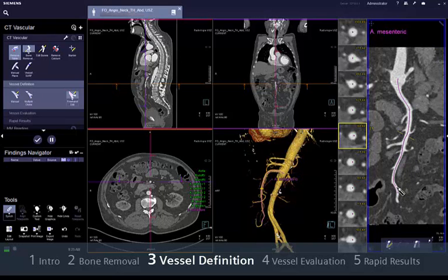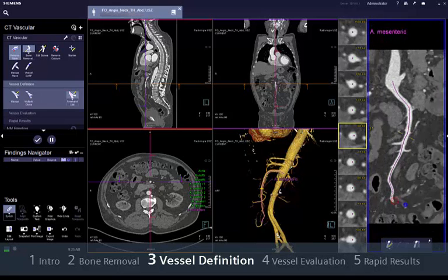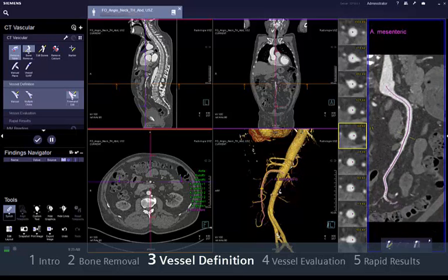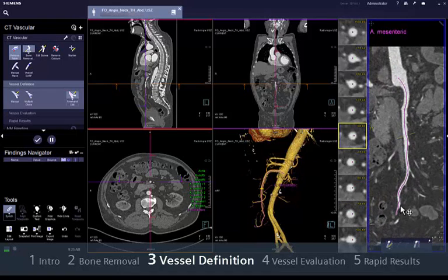You can also extend an existing centerline by clicking over the end point of a centerline. You will realize that it is the end point because it is shown as a thicker point. Then add more points over the vessel with individual clicks and with a double click to finish. To see more editing options, right-click over the centerline.